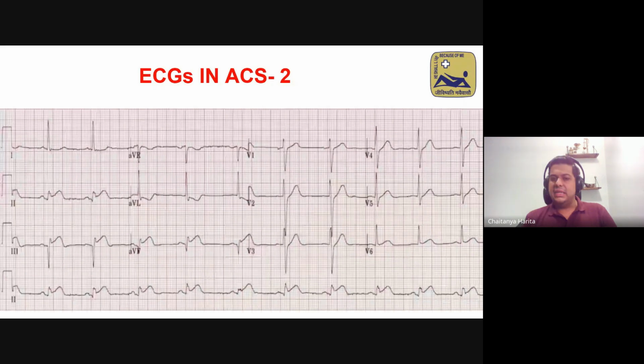And this is the ECG that you see. Okay. Now, if you look at the ECG, your eyes should obviously first go towards the calibration. And the calibration in this particular patient is normal.